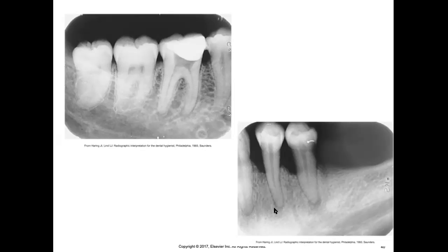And here we can see a little bit more clear in these teeth, especially this tooth. It looks like we had some type of root decay. So here's decay that happened underneath the CEJ, and it caused that cavity to extend into the pulp, down the pulp chamber or the root canal, and cause an infection here at the tip of the apex. So it's actually now into the bone, which is very painful.